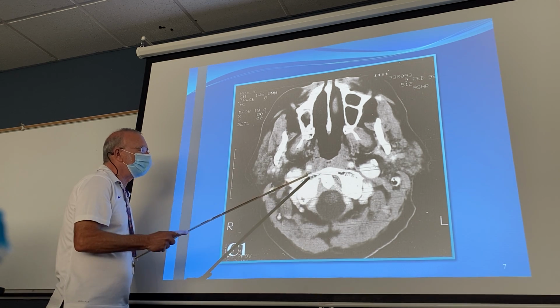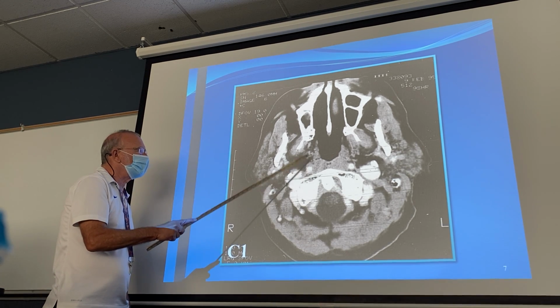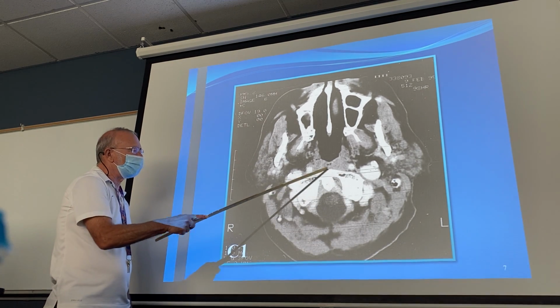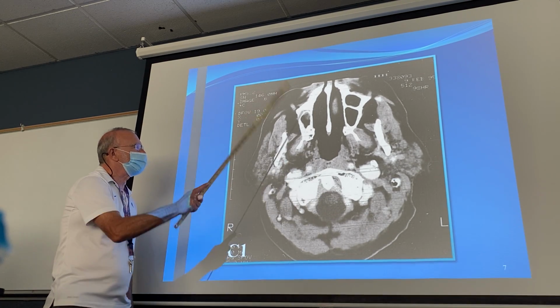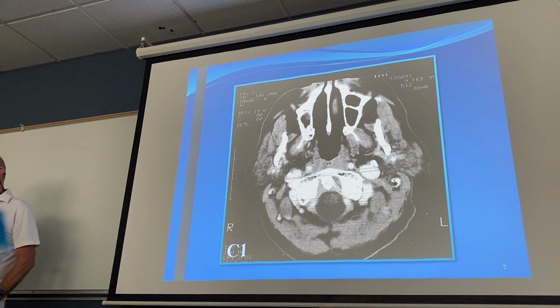So here we have, poor slide, sorry about that, internal jugular vein, internal carotid artery, retraction, we're not going to worry about that, ramus. We'll get into muscles a little bit later on. Again, look at the area. We're picking up the anterior arch of C1 and the odontoid process, nasopharynx. We won't get into facial bone structures beyond that. Please slow me down as we go through these.